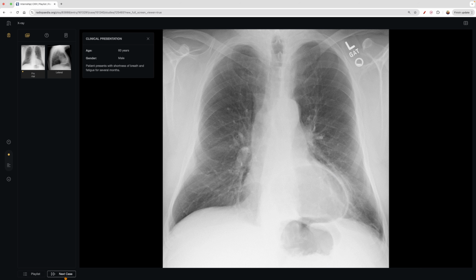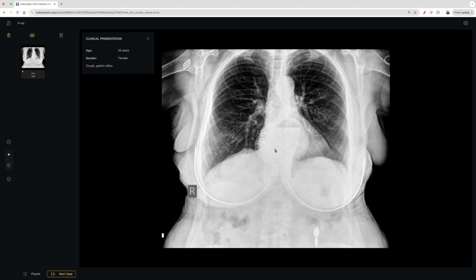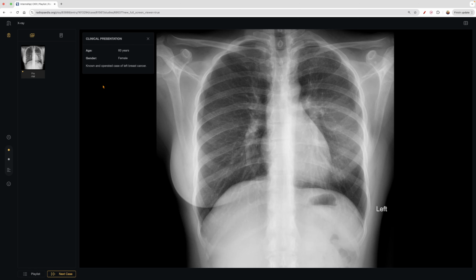when it's slipping up. And then this is another case of the same idea, and you can see here it's this pocket of this little air bubble, right? That shouldn't be there, right behind the heart. It looks a little bit dense. We see the gastric bubble is absent, and that is another hiatal hernia. So almost closing out to the last couple cases here.